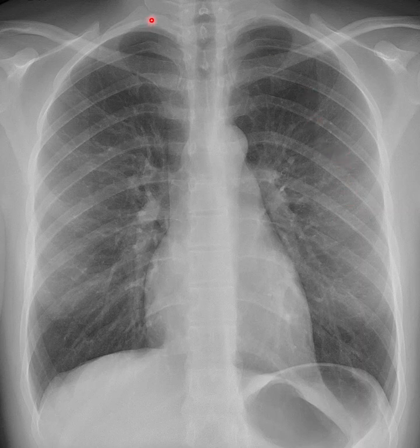All right, and then another thing that's very important is making sure that we get a nice deep inspiration. We want to have the patient take a nice big deep inspiration in so that they fill those lungs up and they expand the lungs as much as they possibly can. So in order to identify that the patient took a nice big deep breath in and was able to expand their lungs for us for the image, we count the ribs. We count the posterior ribs. So I'm going to show you how to identify the posterior ribs from the anterior ribs, and then we're going to count the ribs off.